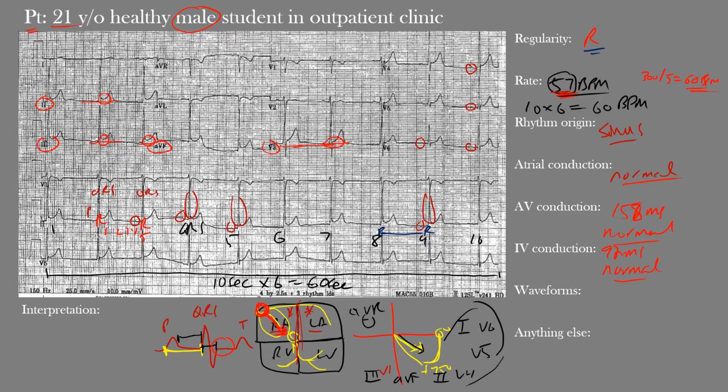Now moving on, there's no ST depression present. That's something important because ST depression is typically abnormal if we see it and tends to be a sign of ischemia. Now the QT interval appears within normal limits. The QT here was 388 milliseconds, and the QTc, which is corrected for heart rate, was 377. Normally we want something below 460 milliseconds, so we're at normal here. So there are no major waveform abnormalities here, but we do have those ST elevation changes that we mentioned.